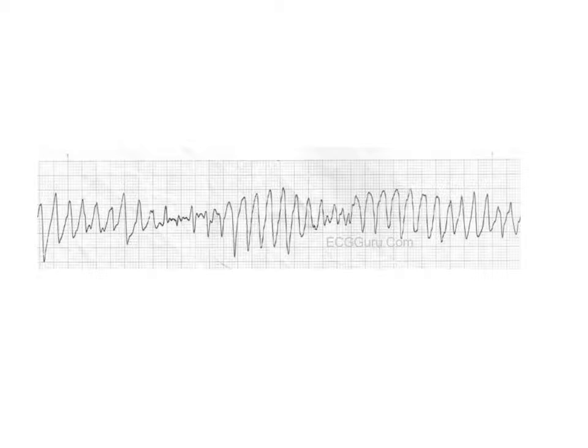All right, what do you see here? Is this regular? No. But what do you see that stands out? You have a lot of different activity, right? One key thing is if you look at the very beginning, the middle, and the end, you have big waves. And then in between those, you have little waves. Those big waves are wide complex, so it's ventricular in nature. You might be saying maybe VTach, maybe VFib.